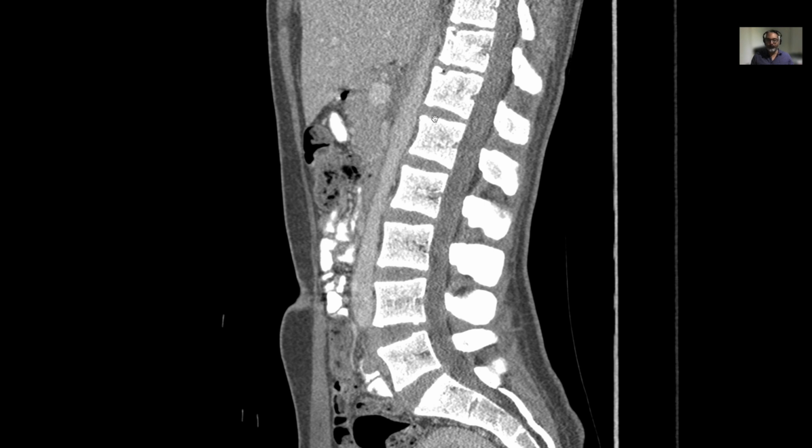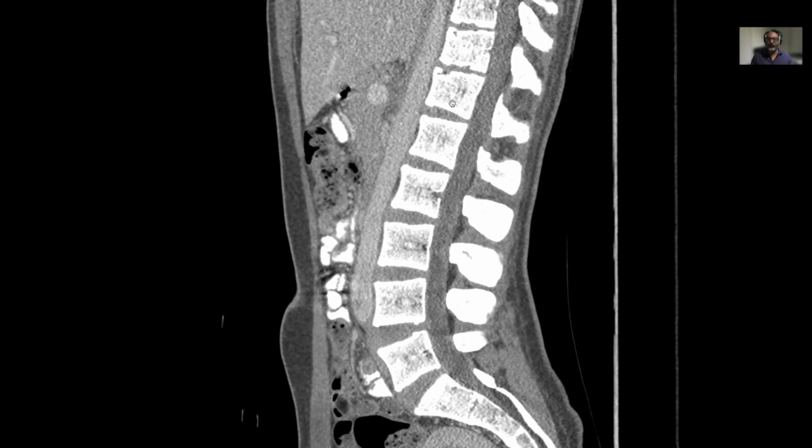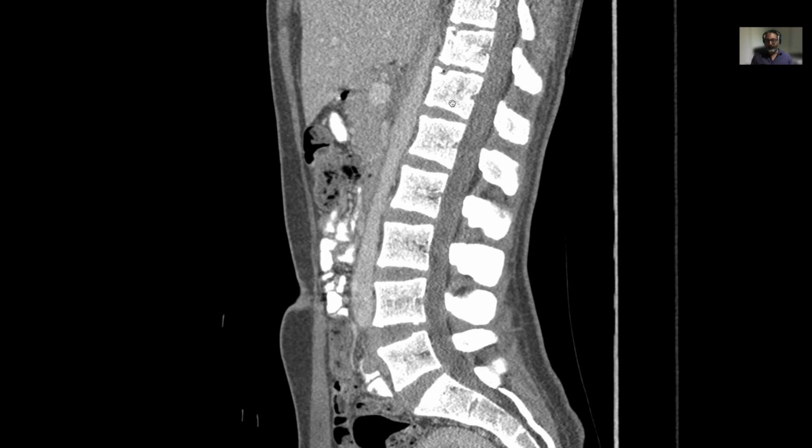And if you look at these vertebrae, you may see a few indentations, and they actually kind of look like fractures, but they're not. Sometimes fractures do look like this. Sometimes there are very small hairline fractures that look like this, and you can sometimes confuse these with fractures. But always keep the clinical picture in mind. If there's no history of trauma, or if there's no back pain or bone pain, this is what normal lumbar vertebra look like. And thoracic vertebra also have these few indentations.